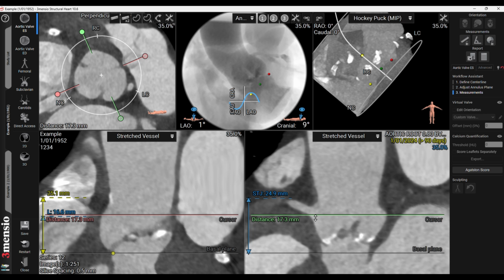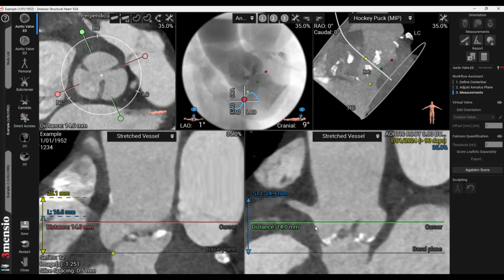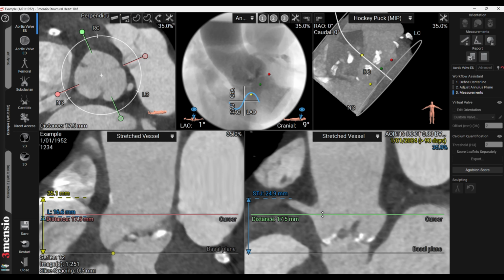Commonly on this cusp, it tends to take off at the top, and people have some confusion about where it comes down from. So we can look about where it curves back in, and we really only need to know where we could stick a catheter inside that coronary to access if we need that in the future. So for this one, I'm perfectly happy with it going about here. It's about the same thickness of that coronary vessel down from the top of it there.